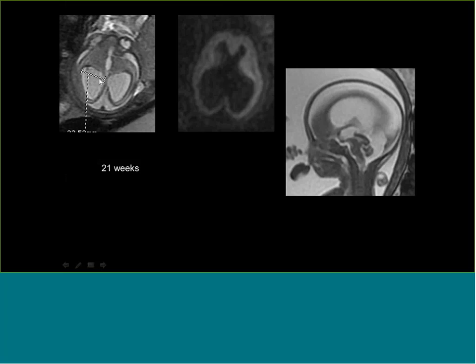and sometimes it's not easy to tell if ventriculomegaly is due to obstruction or not. But when we see very large lateral and third ventricles like that, especially if we see a lesion in the aqueduct, and the head is big obviously, then we can tell pretty certainly that this is obstructive hydrocephalus due to some kind of aqueductal stenosis or aqueductal web. So that kind of concludes what I had to say about imaging of the supratentorial space.